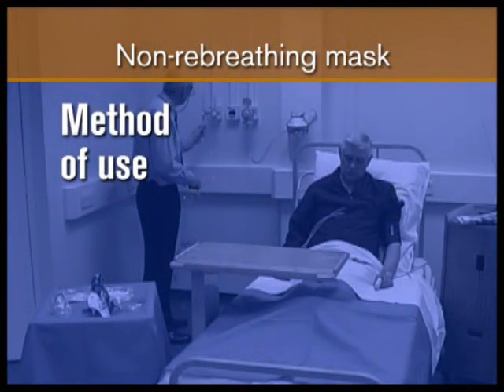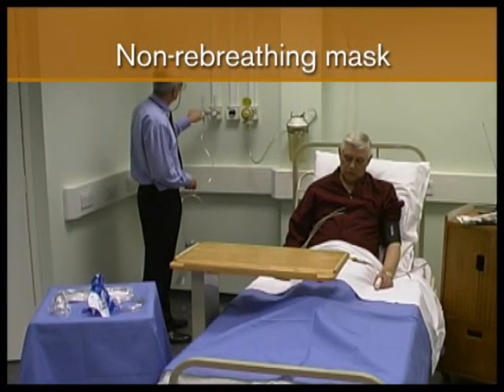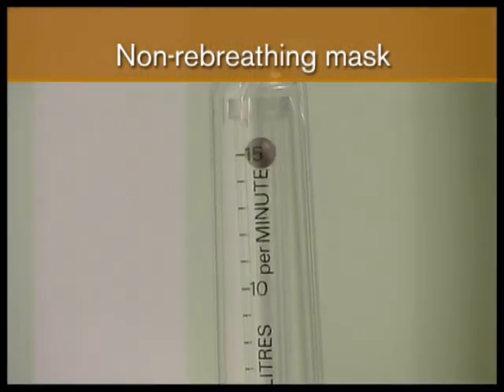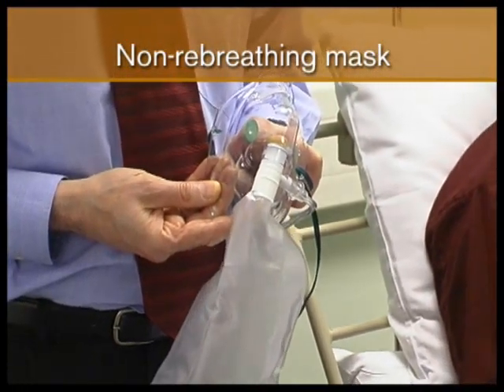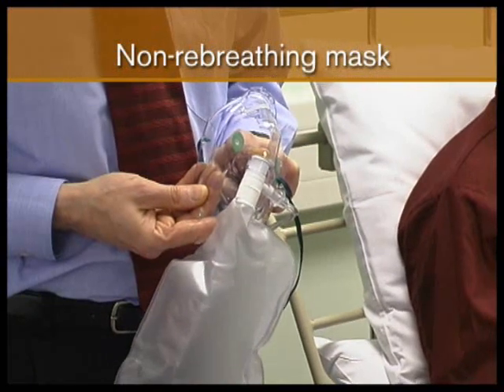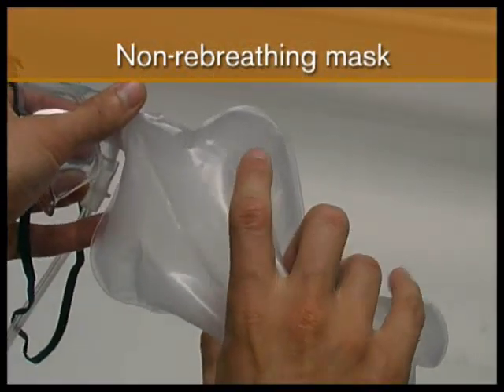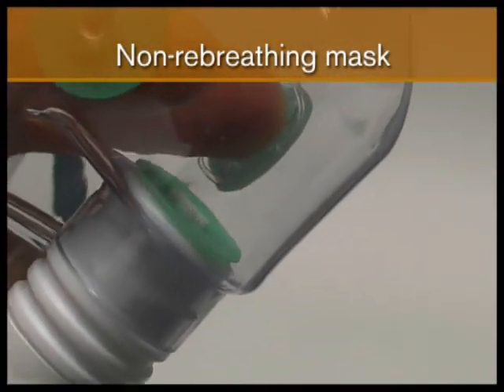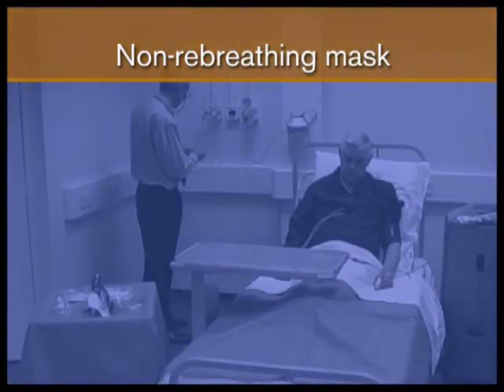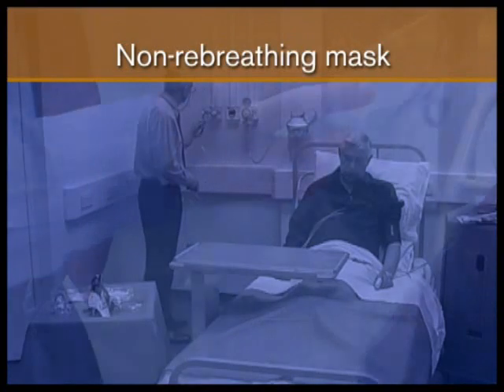When using the non-rebreathing mask, first attach the oxygen tubing to the oxygen flow meter and set the flow rate to 15 litres per minute. Occlude the inspiratory valve, being careful not to damage the valve, and allow the reservoir bag to fill. Squeeze the reservoir bag to test the patency of the valve between the reservoir bag and the mask. If the reservoir will not empty, discard the mask, choose another, and test again.